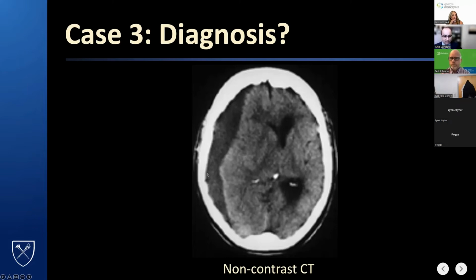This has some hyperdense components in it. So likely it was a hematoma that liquefied later, but hygromas can happen just from a tear in the membrane that allows CSF into the subdural space. Or it can be a hematoma as the result of a fall that eventually liquefies and it looks more like fluid.